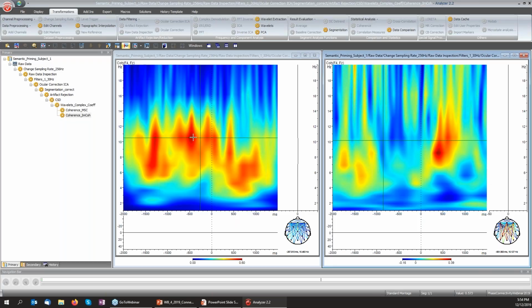Furthermore, if we select a certain time frequency point in this map, we can also see in the connectivity graphs here in the lower corner that the strong alpha coherence is only visible between neighboring electrodes here in the frontal part. This, because they are neighboring, is also a good indicator that this is due to volume conduction.